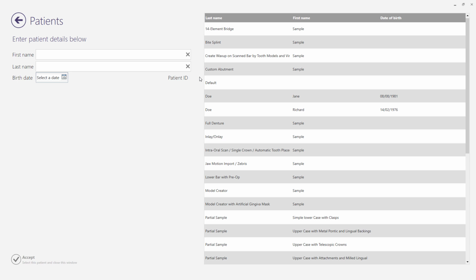By default, for privacy reasons, patients' names will not be included in the file names, and a numeric case ID will be used instead. If some customers prefer to see the patient name directly in the file name, the configuration can be changed by your reseller. However, this should only be enabled if it complies with locally applicable data protection guidelines and a type of disk encryption is used that also encrypts file names.